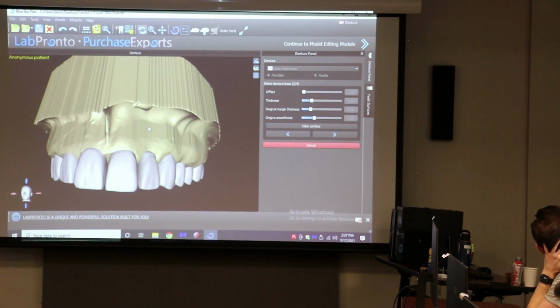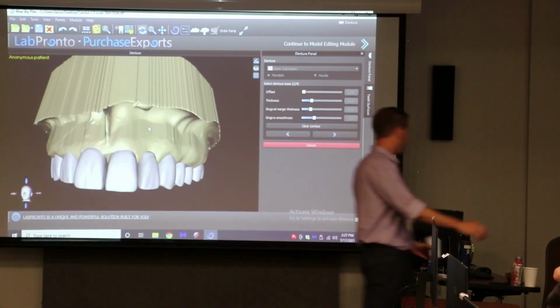If you're expanding the maxilla because you're pulling out teeth and it's a little bigger than it started, you want this thing just to passively go on. Then you can reline it all you want. So 0, and then just hit the next. So you're just going to hit the right arrow. Everyone have their undercut model done?